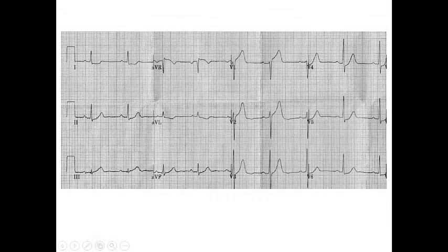Here is another example with a patient who has ST elevation in V1 and V2, which may indicate, of course, septal STEMI or distal occlusion. But here there are additional ECG signs, as the patient also has ST elevation in AVR, which may indicate septal branch occlusion. Here it results in infarction of the basal septum, and this explains ST elevation in V1 and V2 only, together with AVR.